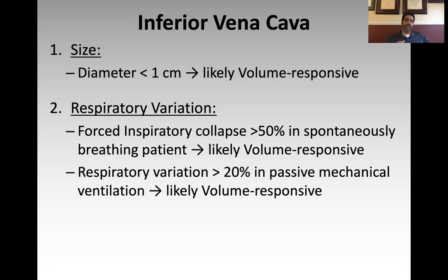The IVC is not the panacea for determining volume status or volume responsiveness, which is really what we're trying to get at. Okay. It is not black and white. In fact, there are really only three situations where the IVC assessment will give you a reliable indicator of whether a patient is going to respond to volume. And those are right here. In every other situation, the IVC is not entirely helpful.